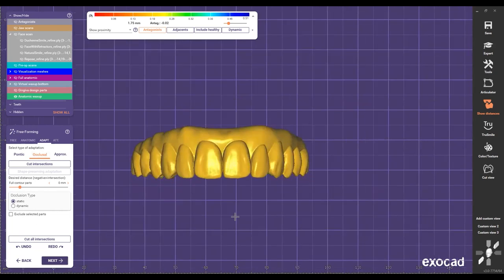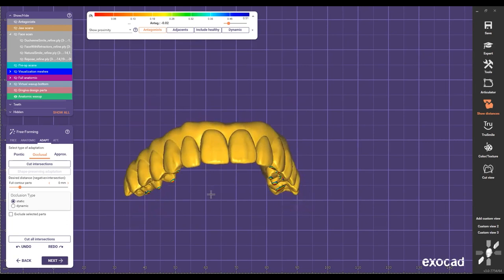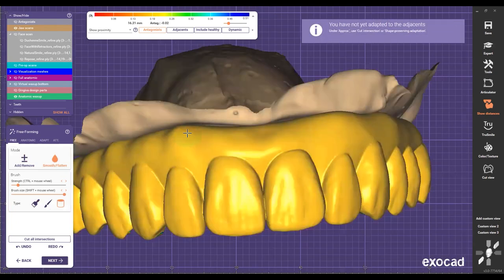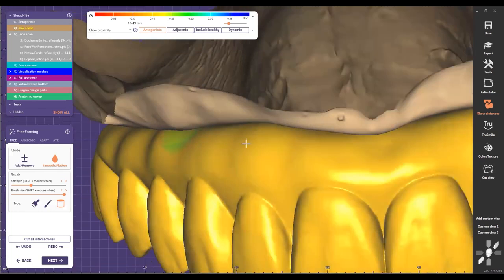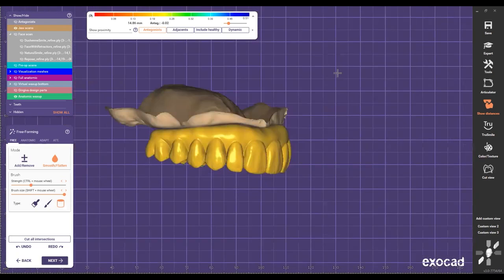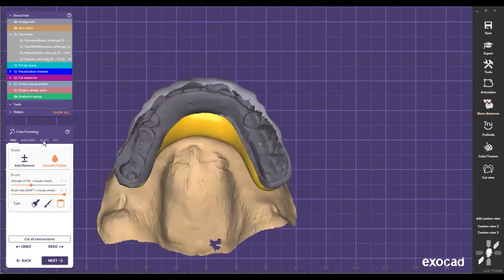Our goal is to save the dentist a lot of time, so that you don't have to be grinding this. So let's say I'm happy with everything. I'm just gonna make this look better there. Something like this, right? Because I was changing things there, pulling things. So once I know this, the contact points are just pretty much right there. Let me see if I adjusted them.